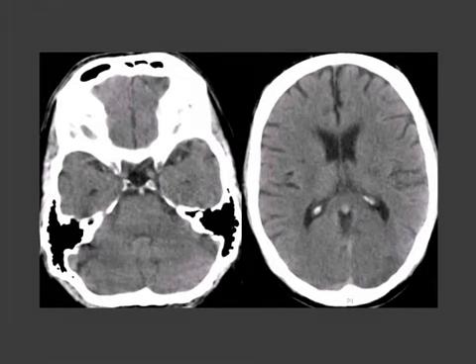So that was stroke. This is another patient who came in a comatose status.